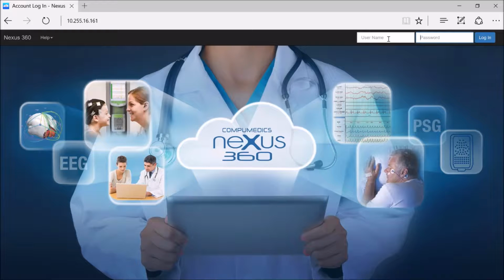In today's session we're going to have a look at the neXus 360 dashboards options. We're using Microsoft Edge on a Windows 10 computer, and we're just going to log in here using our standard username and password.